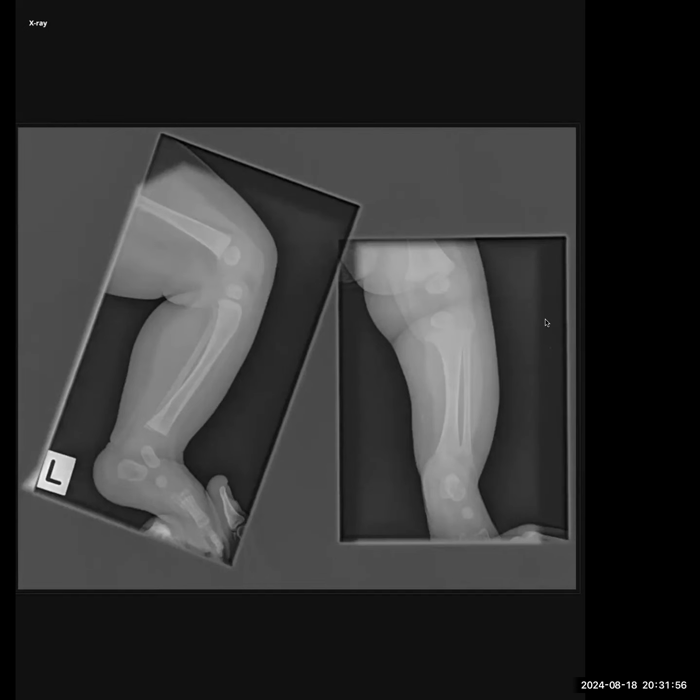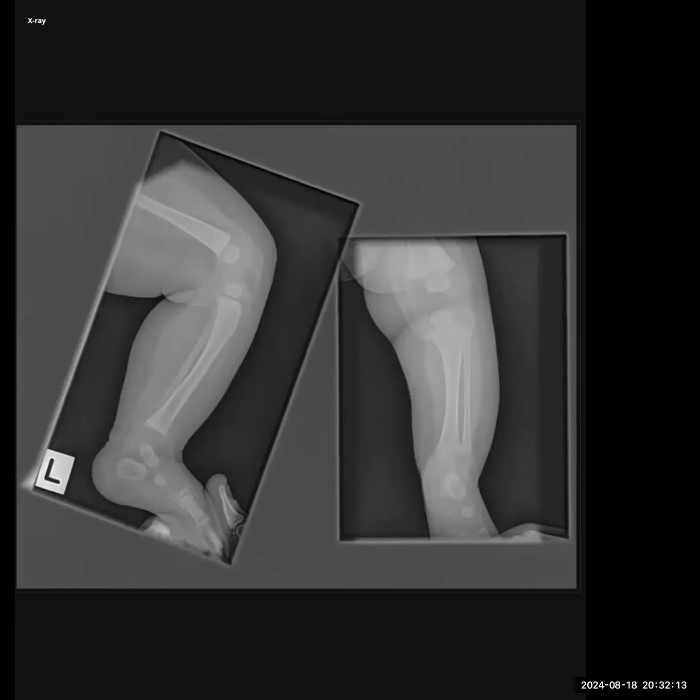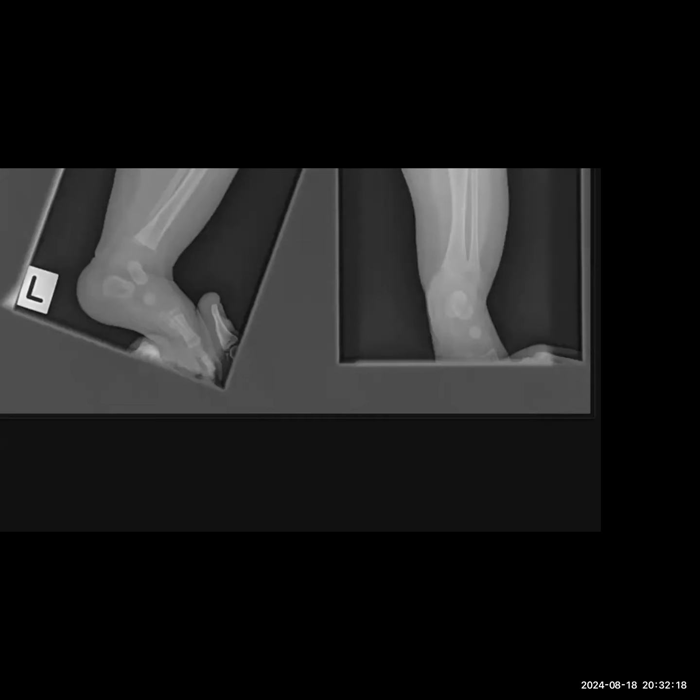Anything else? Does anything else catch your eye? If not, I understand that I can't help you zoom, so let me try and see if I can do something to help you. I don't see the patella. It hasn't appeared yet.